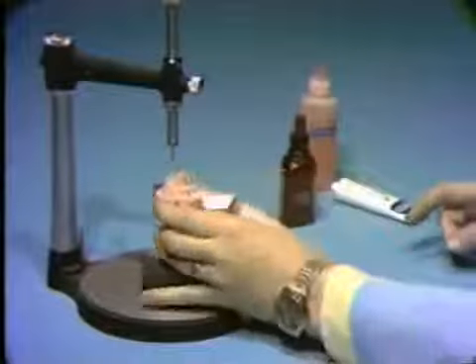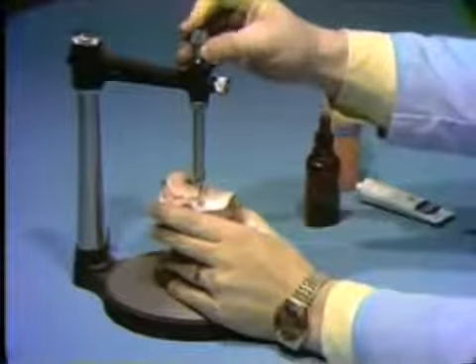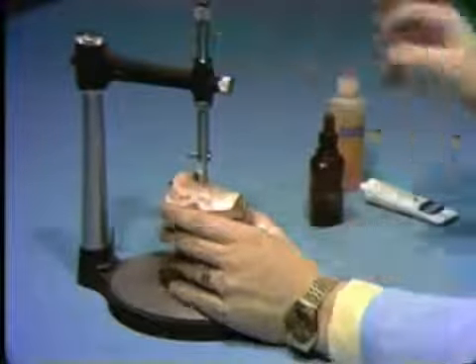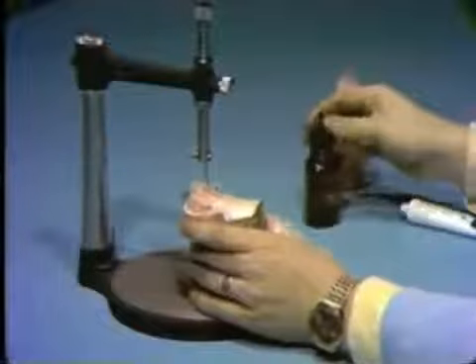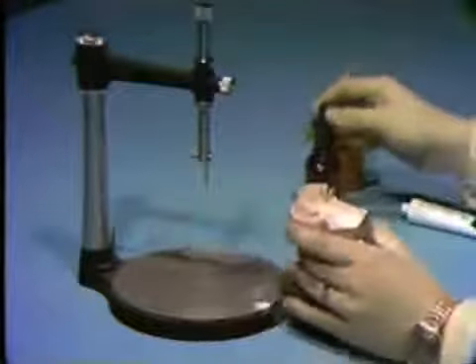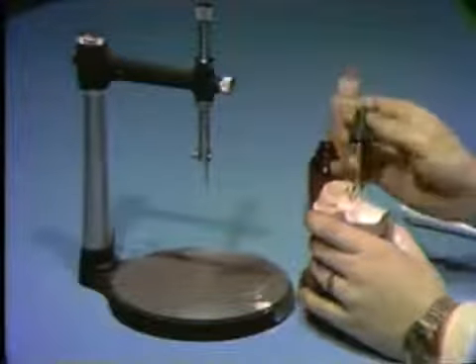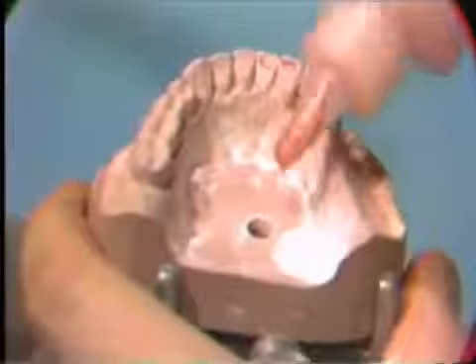An old straight handpiece burr, which has been cut to about 35 millimeters in length, should be inserted in the surveyor spindle holder and locked in place by the locking nut. Keep the end of the rod well above the hole you have drilled in the base of the cast. Lubricate the rod with some Vaseline. Now, fill the hole in the base of the cast with some Duralay by alternately sprinkling powder and liquid into the hole.